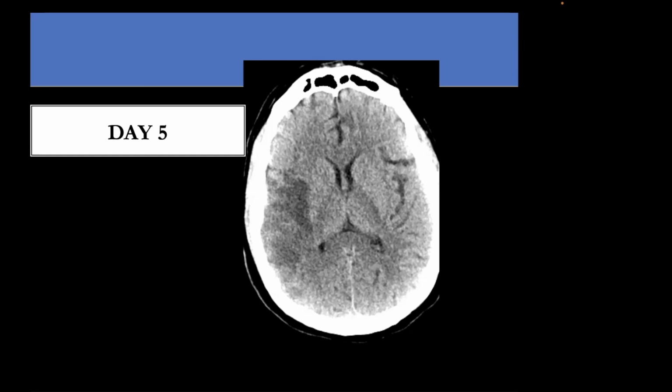That is extracellular water that is due to a breakdown in the blood-brain barrier as a result of either a primary brain tumor or a metastatic malignant tumor. The fact is that what you're seeing is water leaking through the loss of the tight junctions from the either absent or interrupted blood-brain barrier.